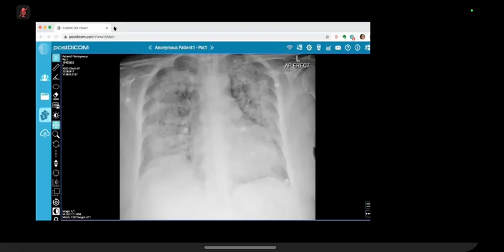There's no pleural effusion though. So differential, there's no retrocardiac opacity. The bones appear normal otherwise on this projection, and there's no hilar enlargement to me, and the hila are in the normal place. There's no hypovolemia of the lung.